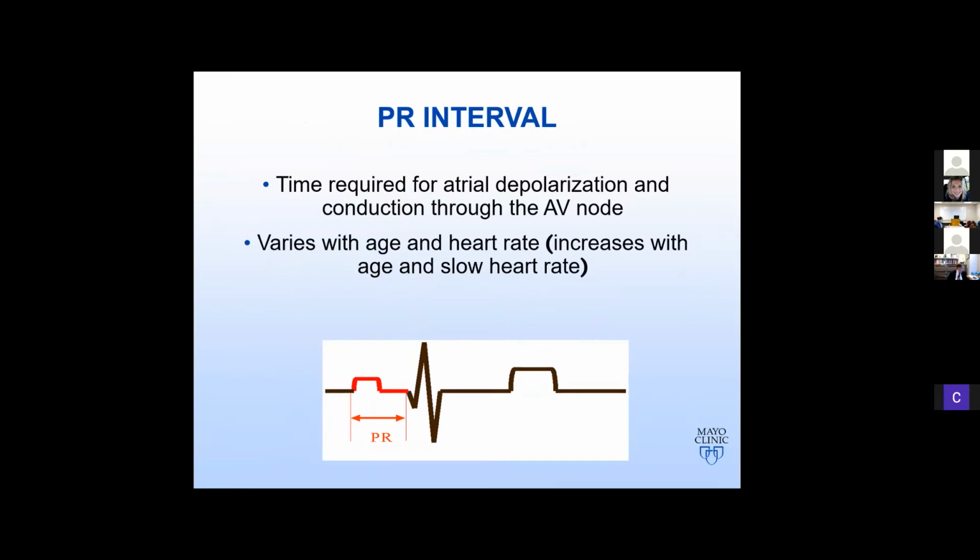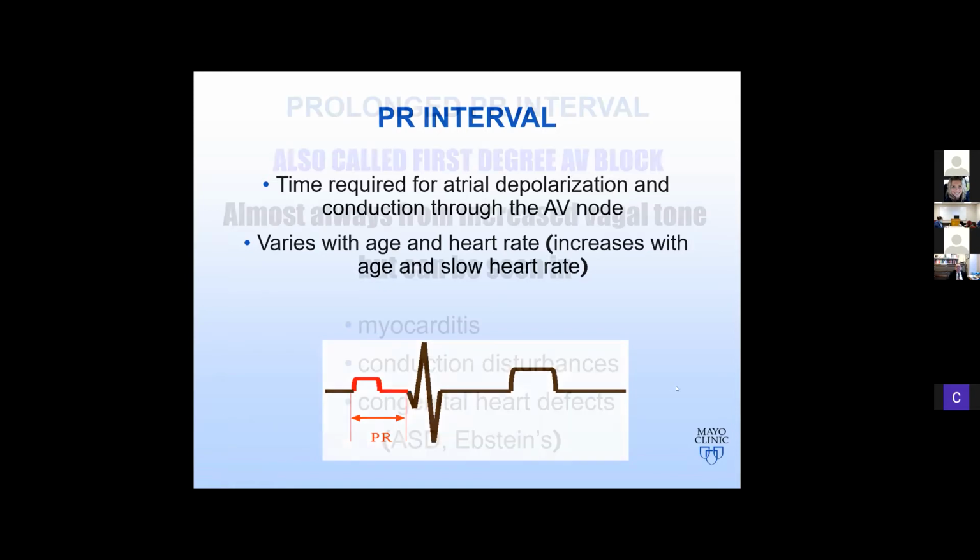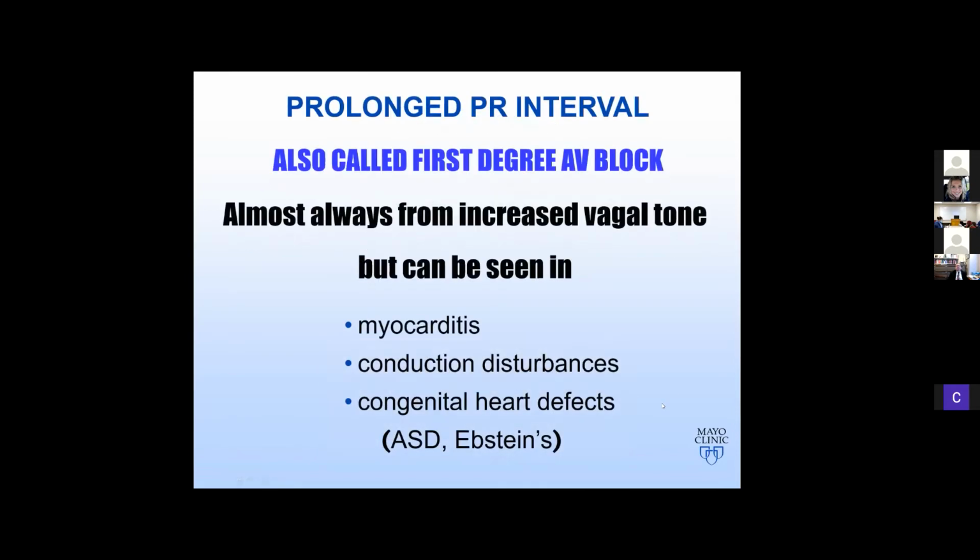Realize that this varies with age and heart rate. It increases with age and slower heart rate. So the older you are and the slower your heart rate is, the longer the PR interval is. So there's a prolonged PR interval.